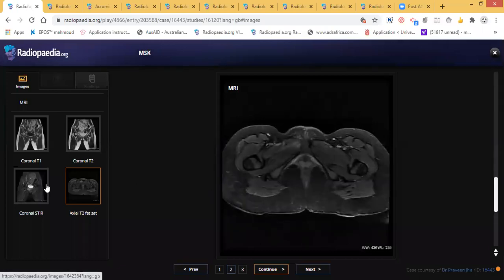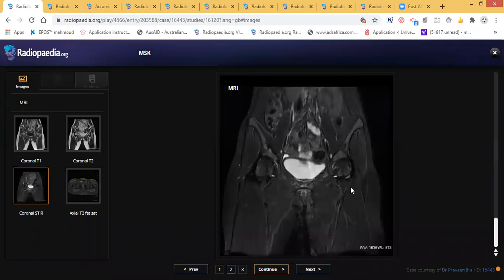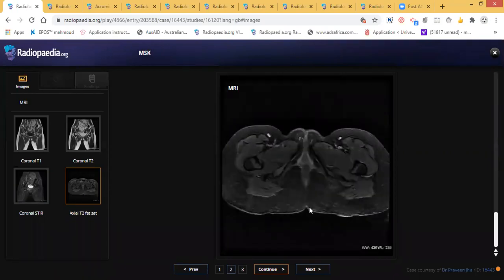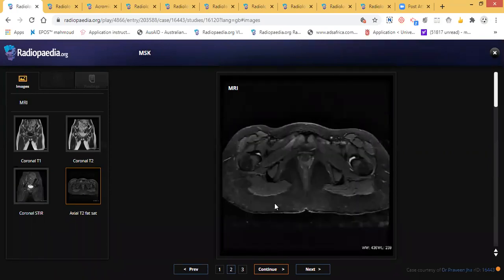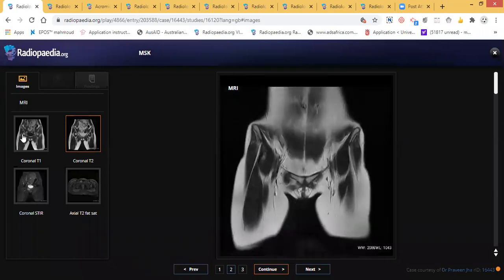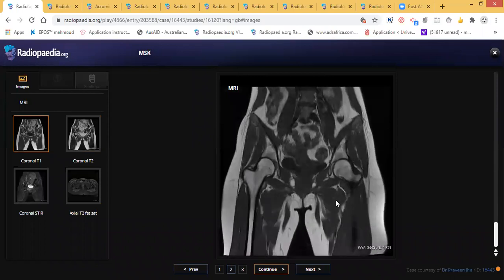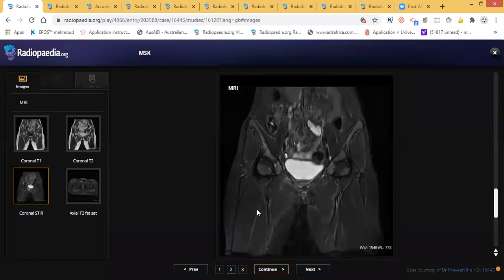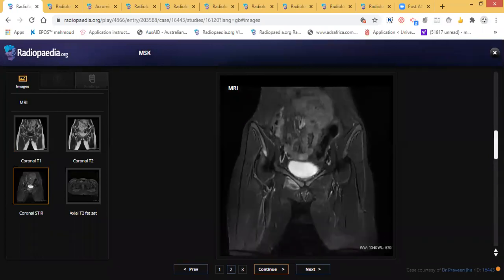Here, when you get this case, it's easier for you to check the coronal image, but the axial also may be helpful. And you will get many questions, either MCQ or short cases. Maybe I will fix the image in this appearance to check the answer.